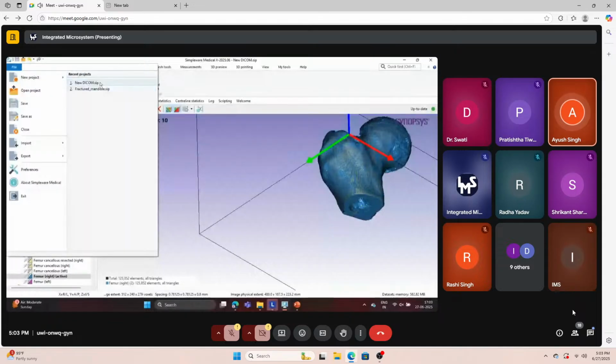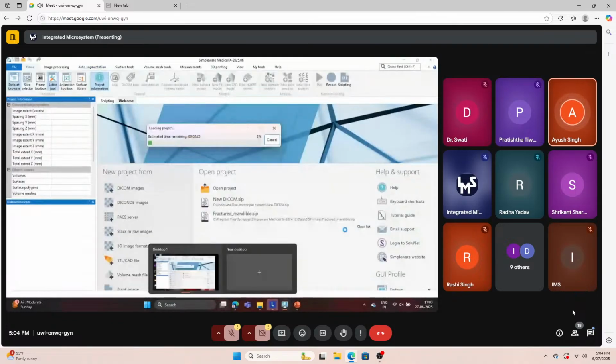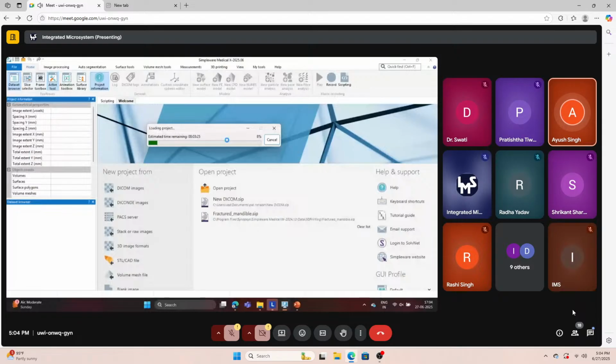So I do have one example of the semi-automated segmentation that I recently did for a cardiac data set. The particular patient had a VH data set, and the segmentation time required using the semi-automated tool was around 30 minutes, and using the automated segmentation, the segmentation took around 4 minutes.